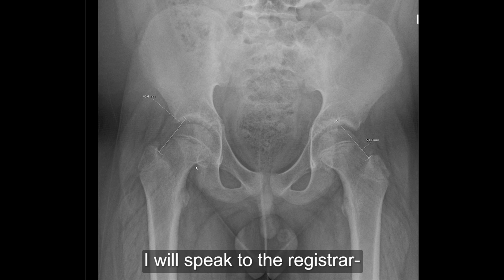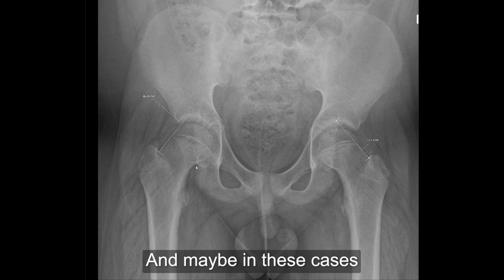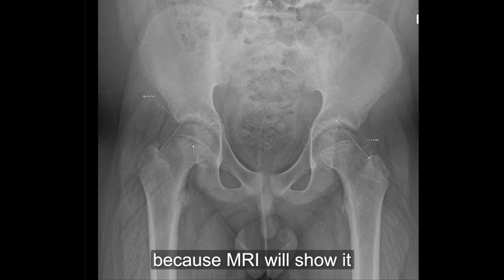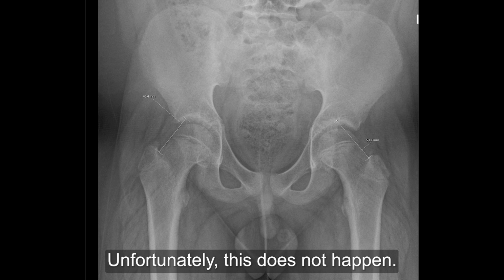I would speak to the orthopedic registrar on call and let them know about the finding of abnormality. And maybe in these cases, it's not straightforward. We would ask for an MRI because MRI will show it much better, will show the edema and will give us a more definitive diagnosis. Unfortunately, this does not happen.